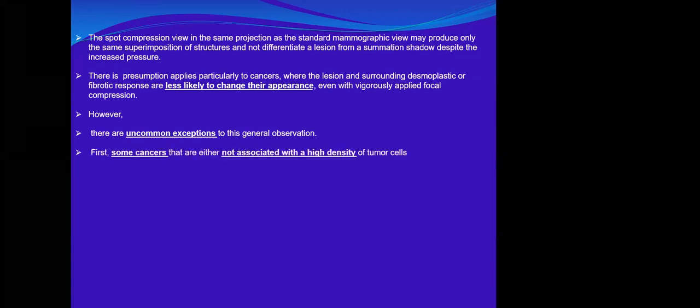Some cancers are not associated with high density of tumors, so it might become less dense on spot compression and give erroneous impressions.